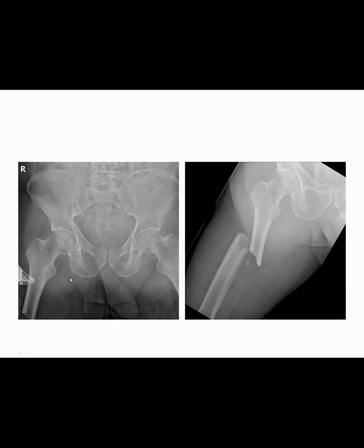Then finally, in the soft tissues, you look for any abnormal edema or displacement of any of the fat stripes that we talked about earlier. You can look for abnormal calcifications or masses. In particular to this pelvis, you also have to examine the bowel gas pattern within the visible portion of the abdomen, in order to be systematic and complete with your assessment.